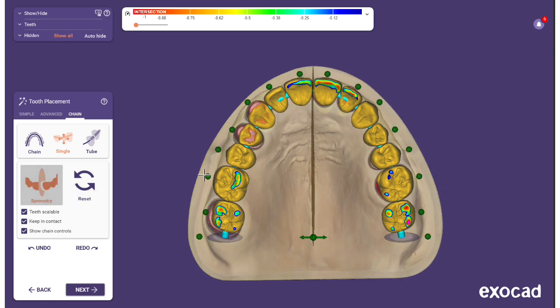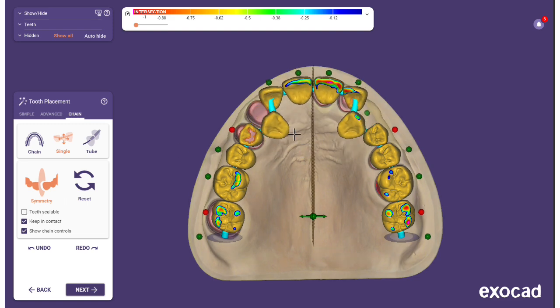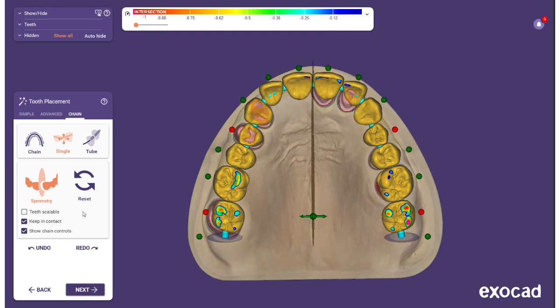The arrows indicate which teeth are used as reference for the plane orientation. The reference teeth are locked. To change the reference teeth, click the control point of a tooth on the other jaw side. The symmetry plane control will jump to the new position and the control points of both reference teeth will appear red. To pin the symmetry plane, click the sphere between the arrows.